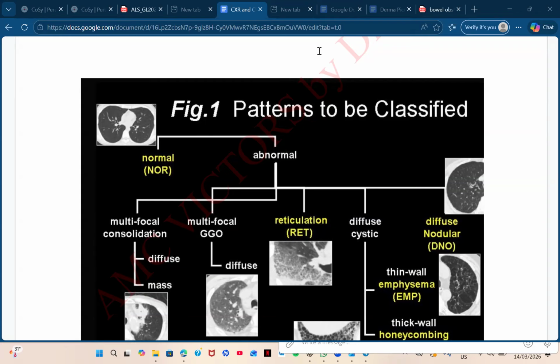So what is the main disease? Are you sure about these answers? Okay, bronchiectasis. What else, mainly where can you see it other than bronchiectasis? Yes, idiopathic pulmonary fibrosis, right, doctors?